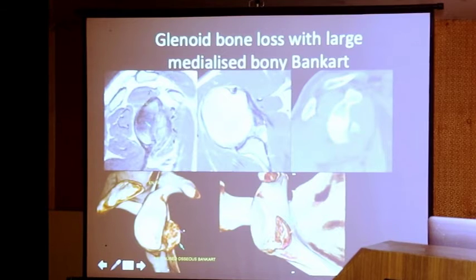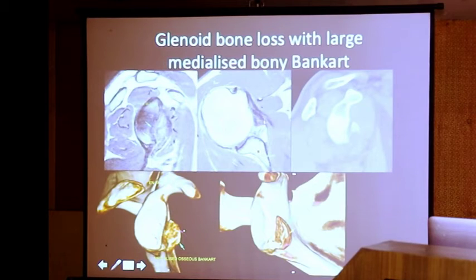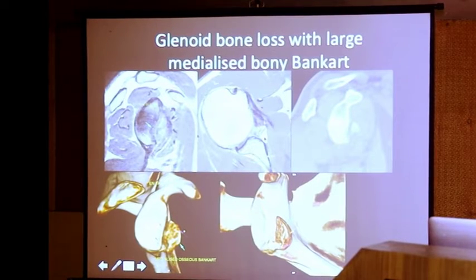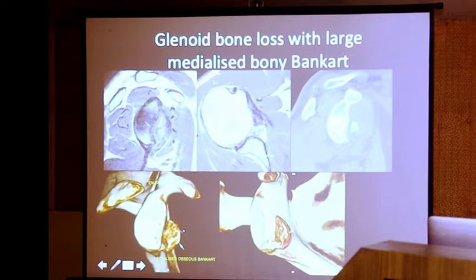that we need an accurate section along the glenoid articular surface. So this has a proper glenoid defect, and there is an osseous Bankart lesion as well in this patient. On the axial images, you can see this is my glenoid articular surface, this is my osseous Bankart lesion, and there is a step. So the osseous Bankart lesion is medialized, that is, it is more medial now, and it is not congruent with the glenoid articular surface. So practically, it is not providing any surface for the humeral head to rotate on. So this is my en-face glenoid, or as you see the glenoid end on after you remove the humeral head.